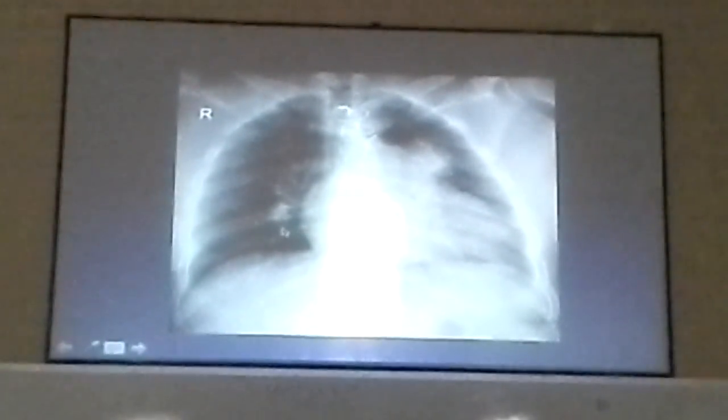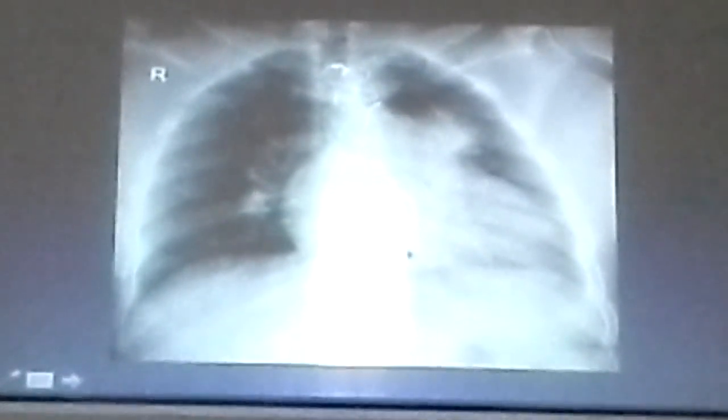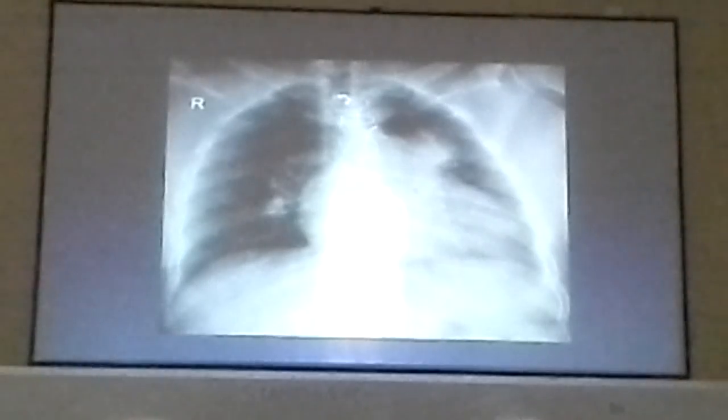Okay. Again, here there is bilateral hilar enlargement. But with hilar enlargement, the heart is also enlarged. And these are sternotomy sutures. And I think aortic and pulmonary valves are replaced. So what is the diagnosis here? Hilar enlargement. Pulmonary artery hypertension. Doctor, in exam, should I write the sign I see or diagnosis? Just diagnosis, you just see the questions and make the best answer. All the diagnosis will be given.